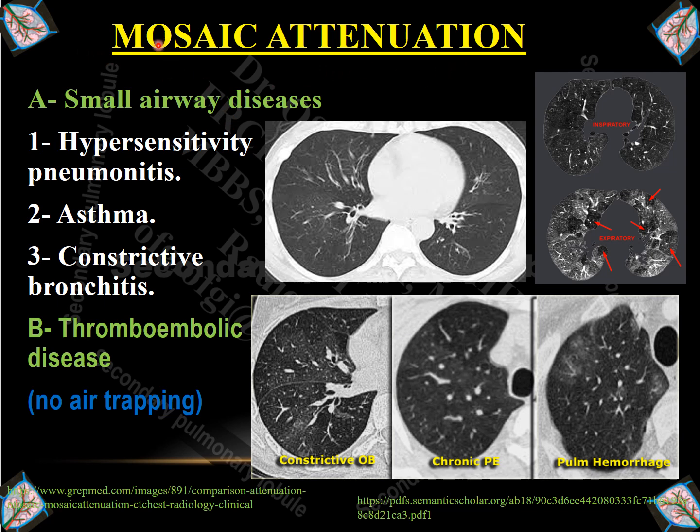As we mentioned before, the mosaic attenuation is the low attenuation area through the lung. And this low attenuation area, as we see, has scanty blood vessels and also has sharp demarcations from normal lung tissue. And if we compare this mosaic attenuation area with this area of abnormality of high attenuation, we saw unsharp demarcations between the area and the normal lung tissue, not like this, which has sharp demarcations, and also scanty blood vessels within this area compared with the normal lung area.